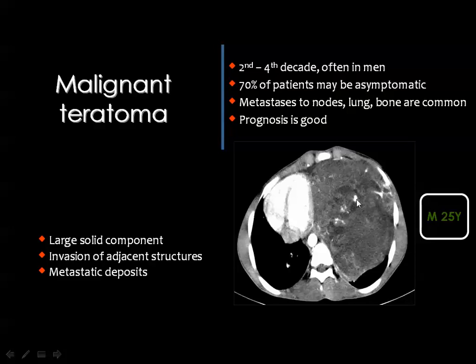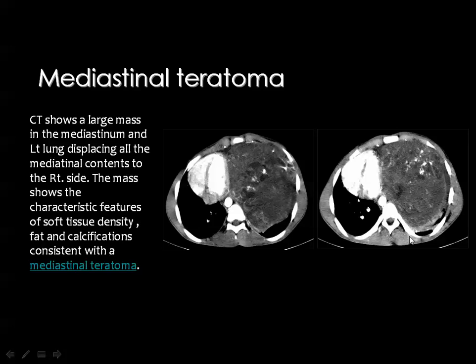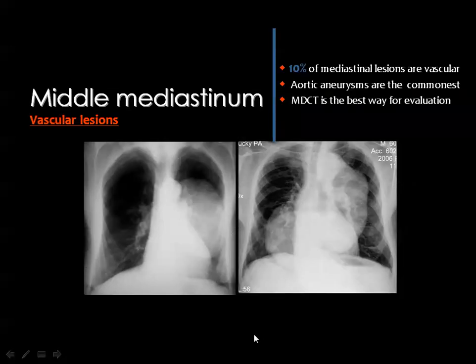One may ask why I don't consider this as a pulmonary parenchymal mass, as this is an adult patient, and bronchogenic carcinoma is most likely, and you have said that bronchogenic carcinoma contains calcium. I say yes, but I didn't say that bronchogenic carcinoma contains fat. And this is very important in the differentiation between masses in the mediastinum and masses in the lung. And here are the scans of mediastinal teratoma showing calcium, fat, and some other soft tissue densities.